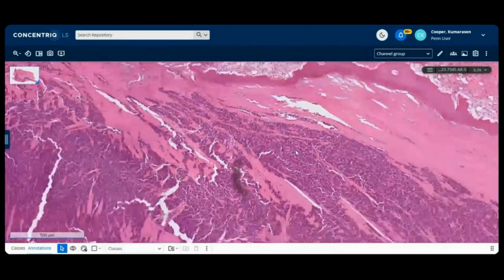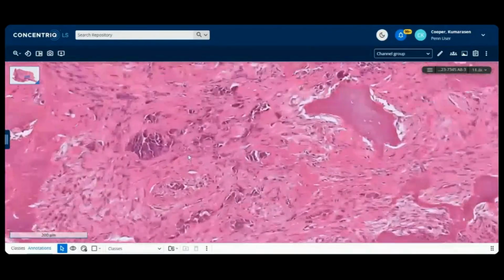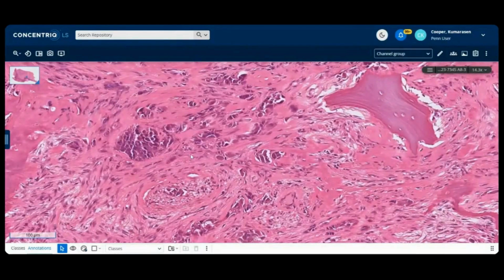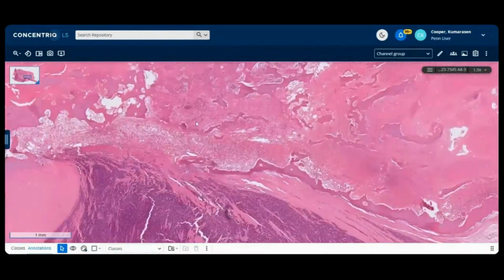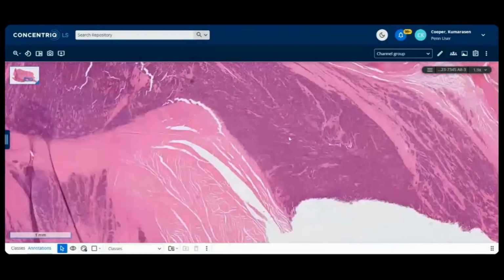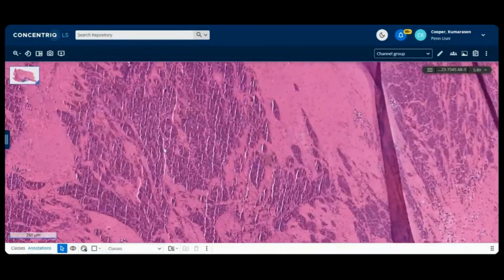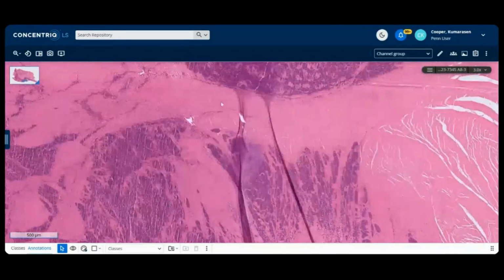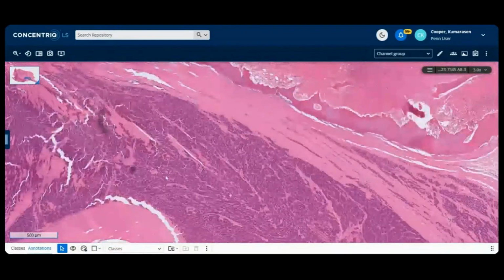And we saw that involving bone. So just if you missed that, you can see it involving the bone here. Okay, I think this was an amputation, as I recall. This particular specimen, it's not the biopsy, it's the amputation specimen. Yeah, the morphology is not good here. There's a lot of crack artifacts. Let's move back to where we were. It's pretty decent morphology here.